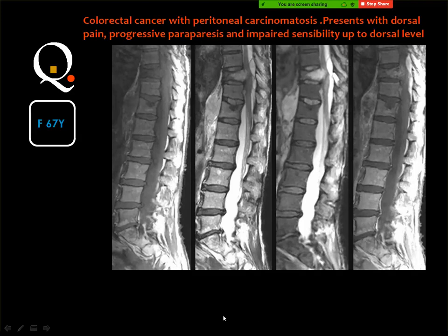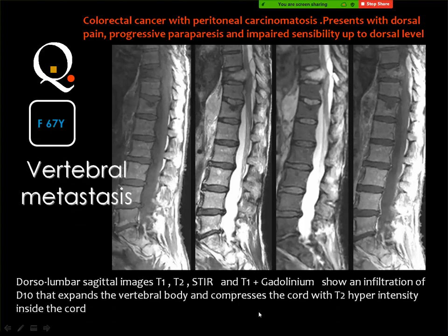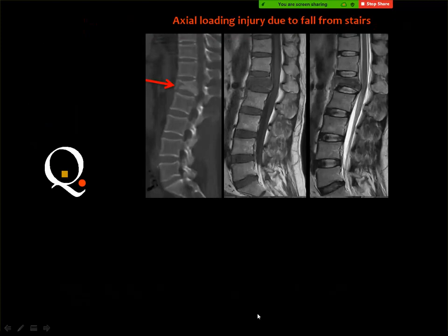This will support the diagnosis of metastatic deposits because you know that a patient with primary malignancy may have an osteoporotic fracture of the vertebra, and the fracture will show abnormal signal. It will show contrast enhancement, and this is very important. Bone marrow edema of whatever etiology will enhance with contrast material. Then the only differentiating point between a fracture like this one and the metastatic pathological fracture is the presence of extraosseous enhancing soft tissue component.